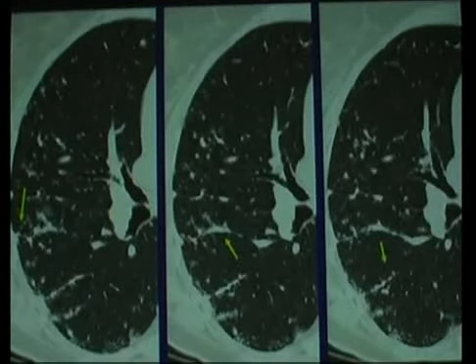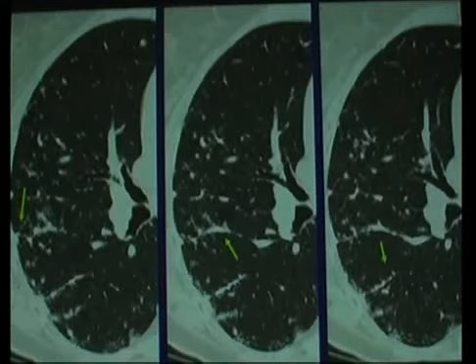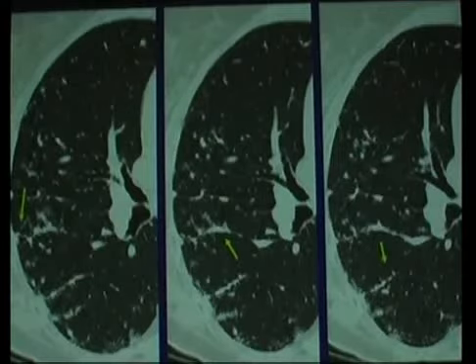It tends to involve the upper lobes, but you're not going to see diffuse total involvement of the whole lung, partly because of its perilymphatic distribution, but also partly because whole portions of the lung tend not to be involved. So if I just showed you this portion of the lung up here, you'd say it's perfectly normal. Again, what to look for?